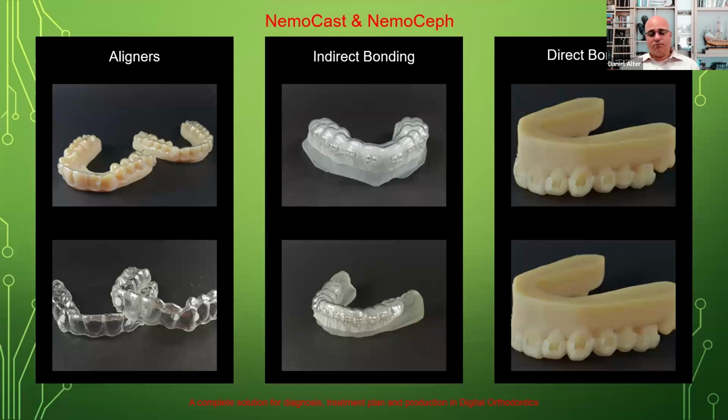But what's more powerful? Yes, these are the end results of the products, but what's powerful is the analysis that the software allows you. It's incredibly robust, and you can do some amazing things, amazing movements, and when I share with you the next phase, the next type of Nemofab, it'll really blow you away. But this is where it all starts from.